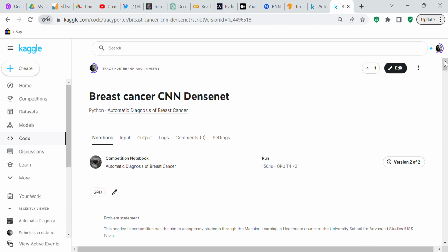And so, I'm under pressure. I really don't have the time to wait around for them to decide to give us a sample submission data set or data frame. And I did my best. I did a sample submission, and I did 1 to 100, and then I did all of the predictions. And so I did my best.